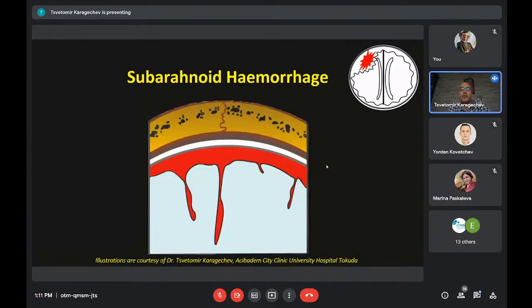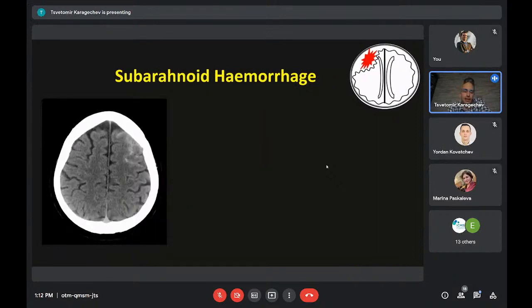So the last thing that I'll show you today is subarachnoid hemorrhage. As you remember, this is beneath the arachnoidea mater in the CSF containing space, the subarachnoid space that tends to be continuous with the brain sulci. I think this is a very typical example. When you look at this image, you see there is hyperdensity inside the brain sulci. We call this a sulcal pattern, and you can see this is the normal brain sulci filled with hypodense cerebrospinal fluid, and I think you can appreciate the difference really well.